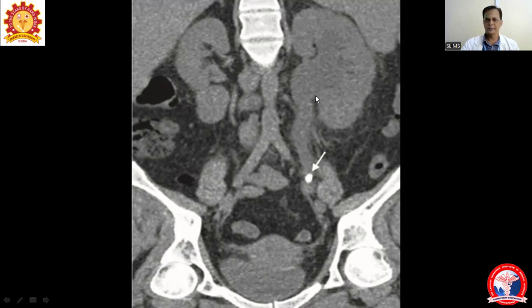Here we get to see an enlarged kidney. I'm going around the renal outline. I'm indicating the renal outline. This is an enlarged kidney. What we are seeing here is a more enlarged kidney with a dilated renal pelvis, where the renal sinus fat is obliterated. The ureter, pelvicalyceal system is dilated. Calyces we are seeing here, they are dilated. Pelvis is dilated, then upper ureter.